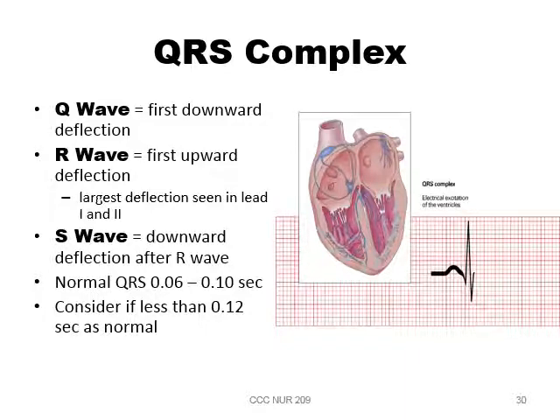But understand that the first downward deflection of this complex, which is this deflection here, that is your Q wave.